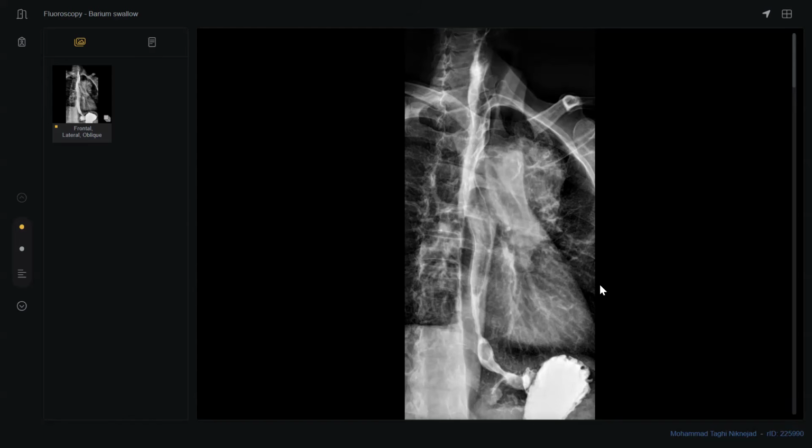maybe there is an area of fistulous communication which is causing this, if the patient has any history of carcinoma, which may indent... Where? Which area are you talking about? So on the left side, just above... Where? Upper zone of the left lung. Okay, sir, you are speaking about this area?